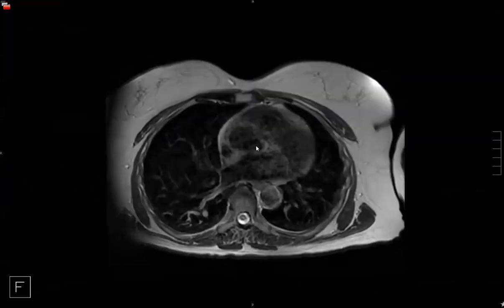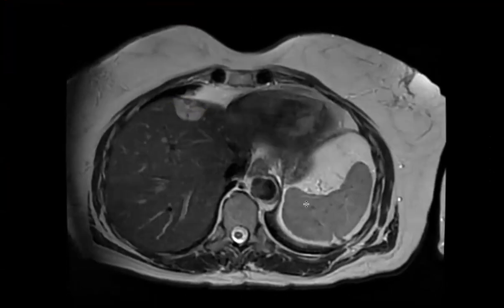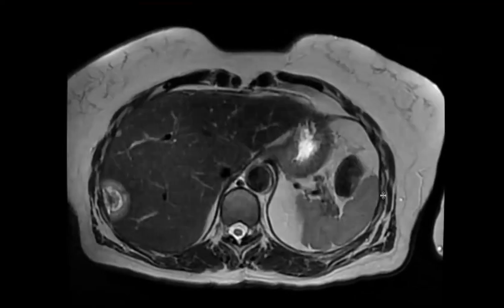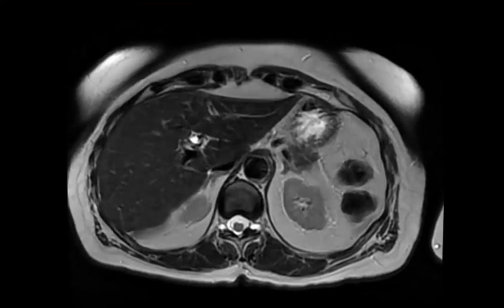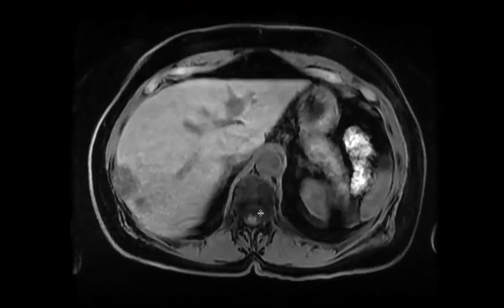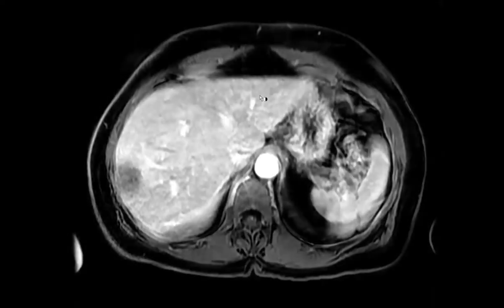Okay, this is a biopsy-proven case. EHE. Good. Tell me about a hepatic hemangioendothelioma. It's usually in younger females, peripheral, targetoid, multiple lesions, and can be indolent or slowly progressive.